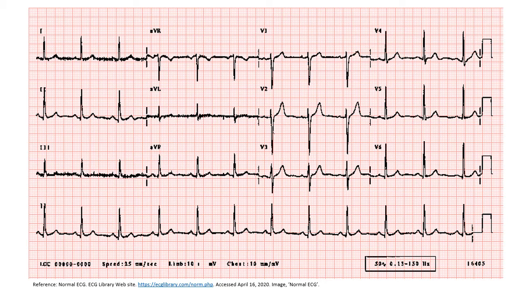we can see that although it's small, there is a small ECG P wave present pretty much across all of the waves that we have here. And that indicates that in addition to the heart rate being 69 beats per minute, it's also a sinus rhythm. Alright, so those are two positive tests so far in identifying whether our ECG is normal or not.